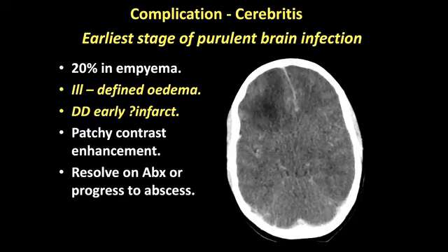So why is this a problem? Well, because it can be very difficult to diagnose. It happens in 20% of patients with empyema, but often these patients, particularly in resource-limited settings, are going to be getting repeated CTs because we just don't have the capability to put them all on the MRI scanner, particularly if they need sedation. And in the beginning, particularly when they've been draining empyemas, you may just get ill-defined edema. And it's difficult to know, is this just edema or is it an early infarct?